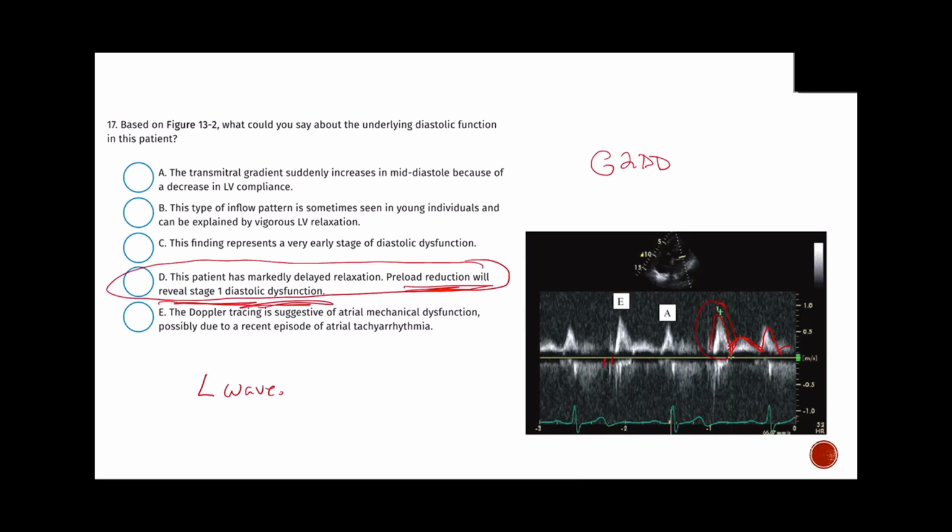So this is showing us that we have evidence of grade 2 diastolic dysfunction, so pseudonormal, as noted by what looks like a normal E to A ratio, but a rapid deceleration time, right? So blood flow went past the mitral valve into the left ventricle, which is stiff. Once it hit equilibration, flow stops really quickly, so that we have a really quick deceleration time in our flow pattern.